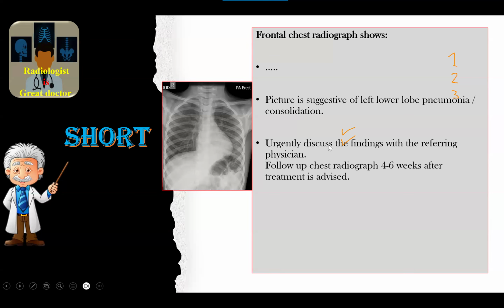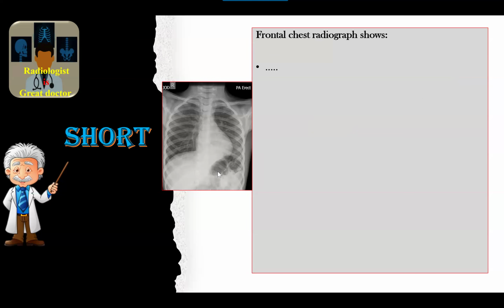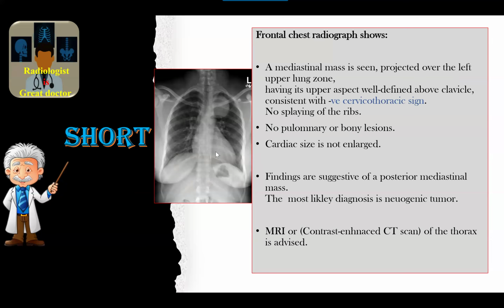What about the management? Urgent referral to the clinician to start medical treatment, and follow-up radiograph after 6 weeks from treatment. This is a simple report, not an oral case. Please, my friends, differentiate between oral and non-oral cases.